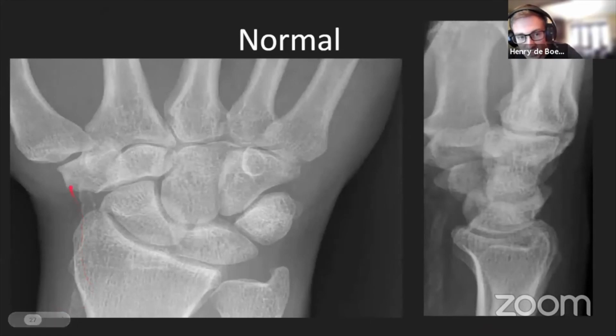Because of the calcification: the calcification is never normal, but you can debate what's normal for age. Most people in their 80s and 90s are going to have some vascular calcification, but the more you've got, it could be due to renal failure, hypertension, hyperlipidemia. Yeah, all the normal causes of atherosclerosis and arterial disease.